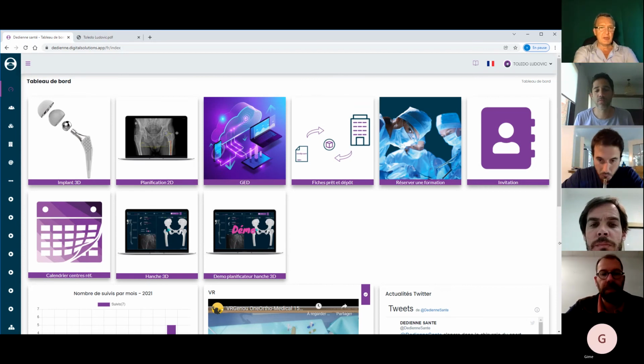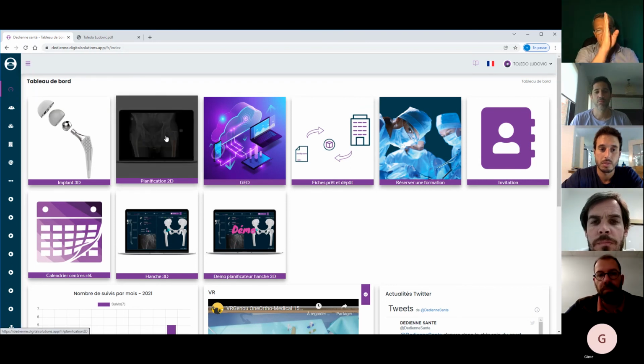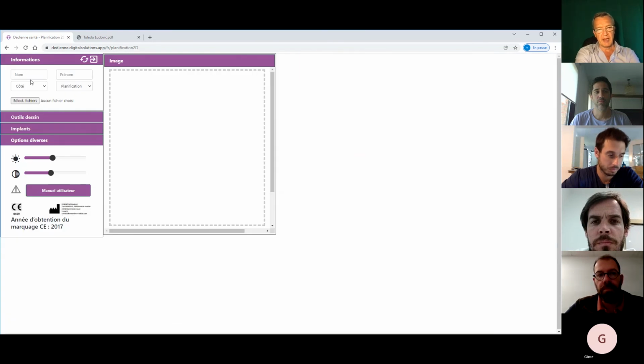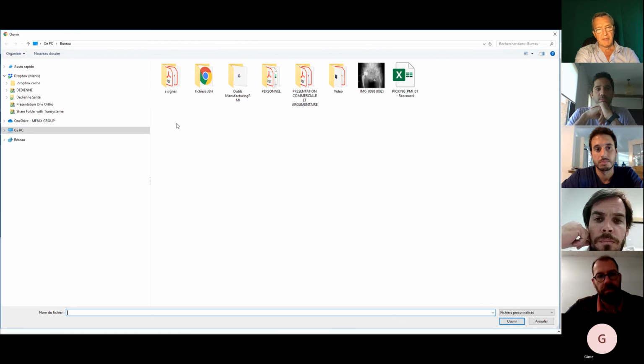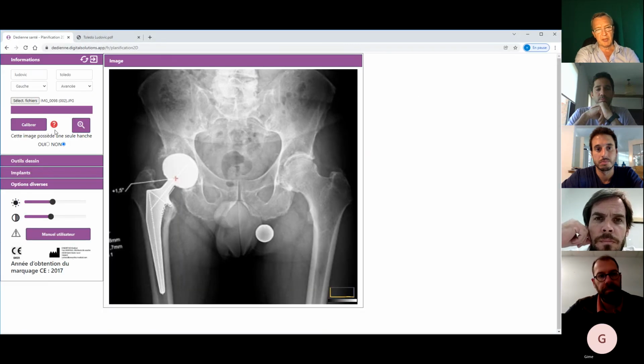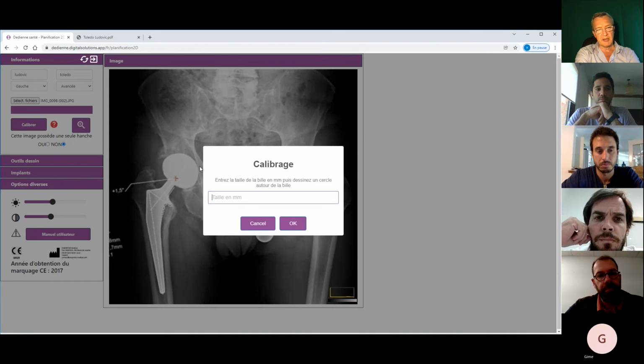I think this 2D planning system is very user-friendly, and it looks easy to do. The only thing is the trapezium, which is the way to get exactly the actual line of the proximal femur. That's the reason why we need to draw a trapezium for the line of the proximal femur, but everything else looks very user-friendly.